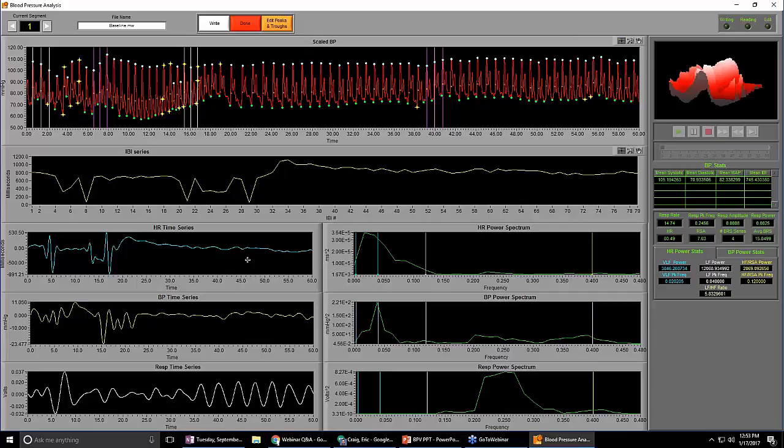And this is pretty simple here, but again, this is a dual time plot. So we have milliseconds on the left. We have time on the bottom, a 60-second segment. You can see that we're still in a 60-second segment up there. And then we're just looking at the time in between, so pretty self-explanatory there. Just another visual check here. So somewhere around 4 to 5 seconds, and then anywhere from 11 to 16 seconds, or even as far as 22, would be something that we would want to look at. And that's verified here in the data, where we're seeing these yellow stars, just letting us know we get to check on that information.